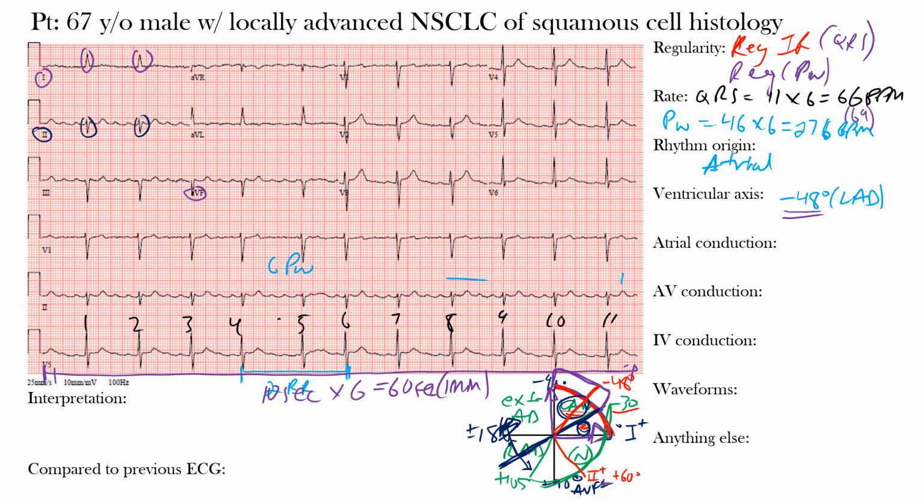Okay, so let's take a look at that. If we erase some of this here, lead 2 is probably the best lead we have to see these P waves that we're talking about. And notice that here's a P wave, here's a P wave, okay? There's actually a P wave that's buried within this QRS complex, and then here's another P wave that's buried within that T wave. Notice that the P waves that come after are smaller in amplitude. P wave buried somewhere here, and then notice this T wave also has a P wave within it. That's why the amplitude of these T waves is higher, because you have a P wave buried within it. Hopefully that makes sense. So no abnormal atrial conduction that we'll mention at this point here.